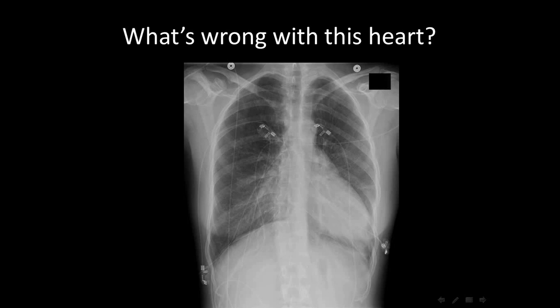So, have a look at this image and tell me what's wrong with this heart. Do you see any abnormality? It is enlarged. Is it enlarged? Enlarged or deviated to the right. Or deviated, yeah. Because I don't see the right atrium clearly. Yes. So there is loss of right cardiac border, right? There is the left deviation of the heart.